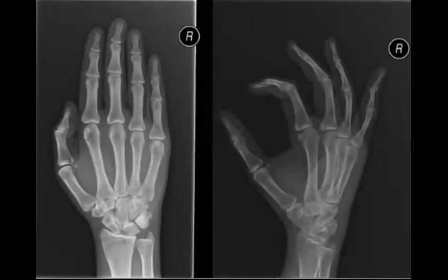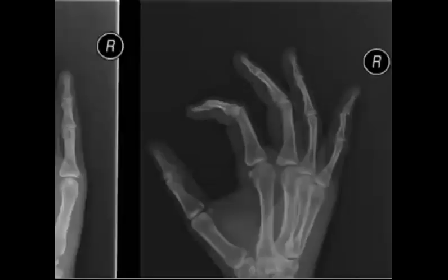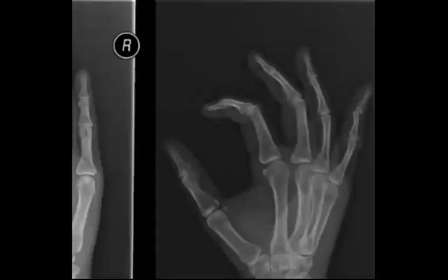The FRCR is like they give you 30 cases of rapid reporting, and almost 50% of these cases are normal. Then it is your role to know which is abnormal and characterize it well. So for example, here, the abnormality is in the little finger. So probably you should zoom in to find the little finger abnormality, and focus with your eyes, like what I do now, in the little finger to know what the abnormality is.